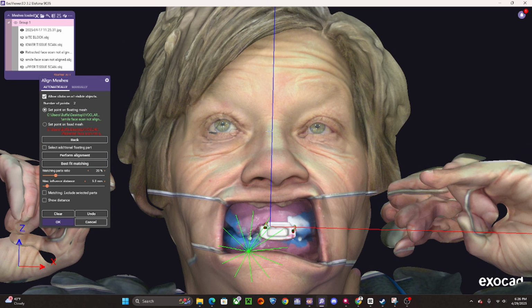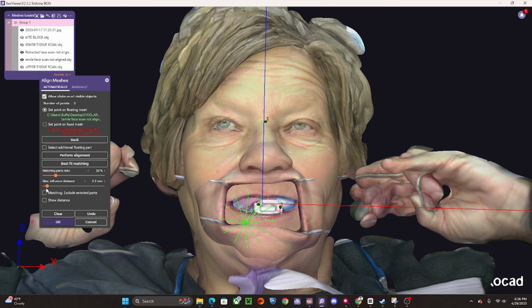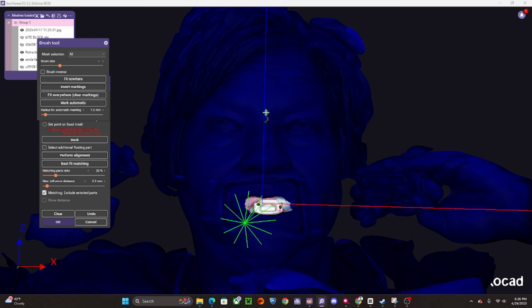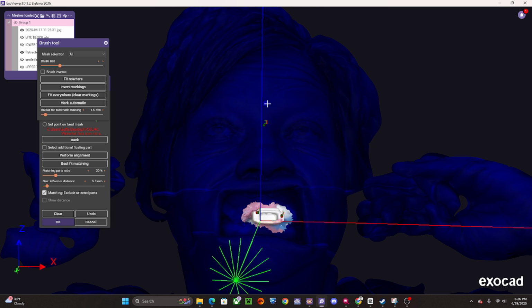So I'm going to also include the bridge of the nose in our alignment. Because when we think about the face and how much skin moves when you retract and change your facial features, the 2 things that stay constant should be the bridge of your nose. That would be one of the objects that are more closely hard stitched to your skull. Or you have your mouth, right? And that's attached to your maxilla.